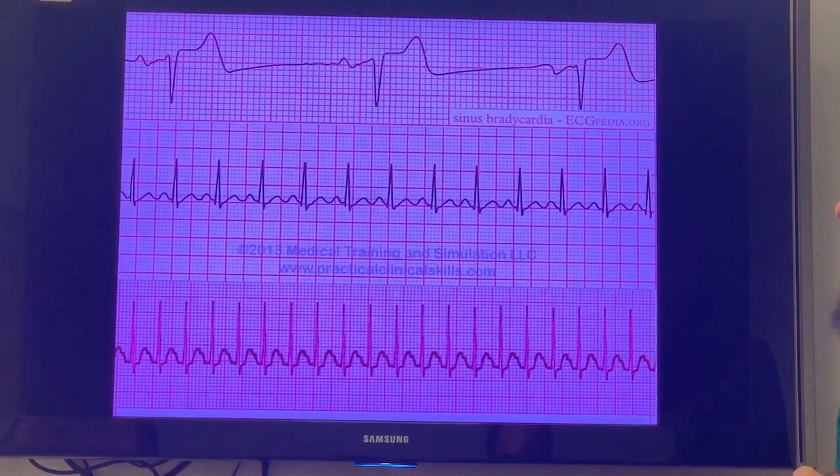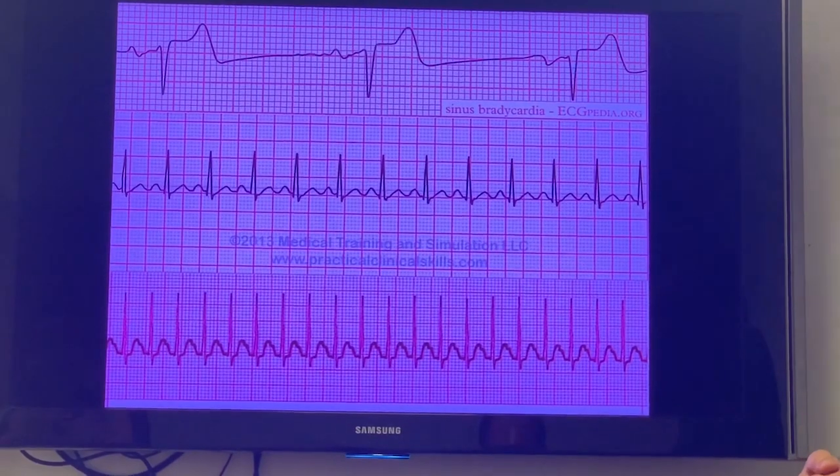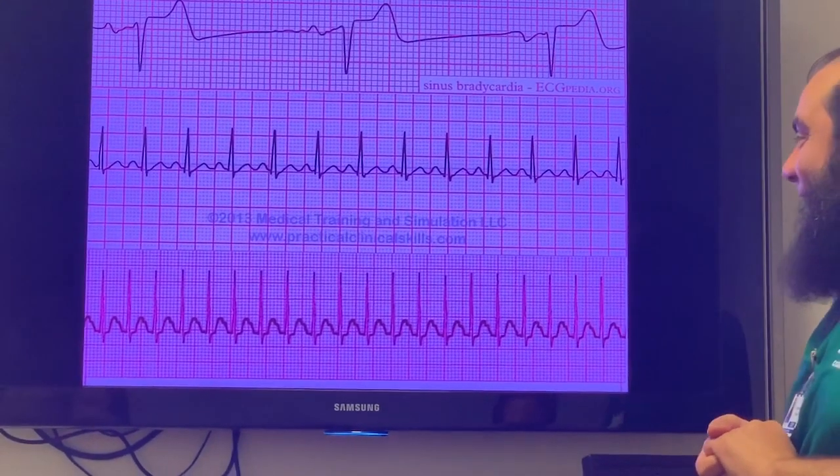1500 divided by 7. Okay, gives how much? I don't know. A lot. More than it should be. Okay, yeah, a lot.